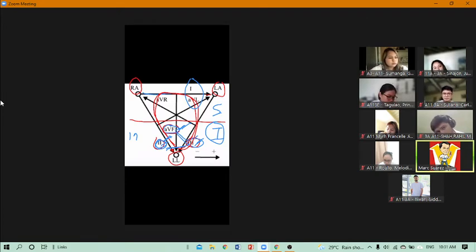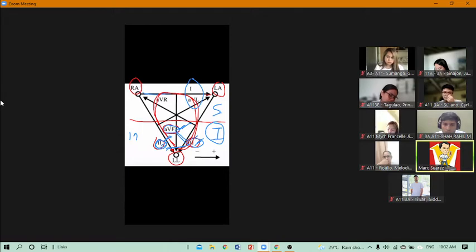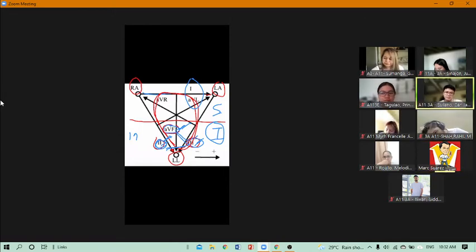If we only see an ST elevation in aVF, what will be our conclusion? Is it significant or not significant? Not significant, Doc. Very good. Why? Not contiguous, Doc. Very good. All or none.